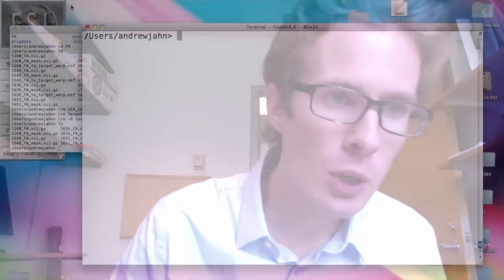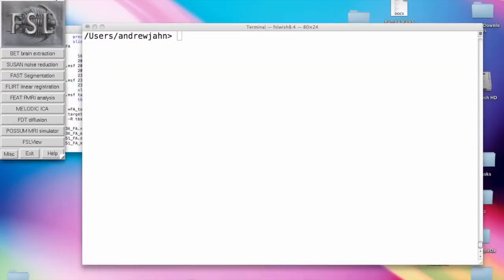Having just covered a couple of pre-processing steps for DTI data, namely distortion correction with top-up and eddy correction with the eddy tool, we're now ready to move on to actually creating and fitting the tensors. And this will create these FA, or fractional anisotropy, maps. So to do this will look pretty similar. We did it with some example data just a few videos ago.